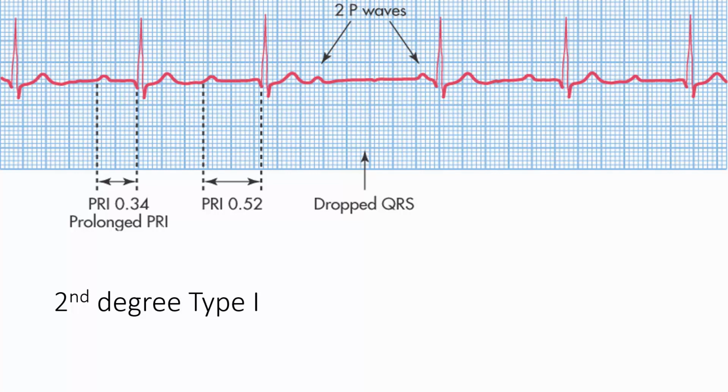I'm sorry, guys, I forgot the PR interval. That's the most significant thing here. So when you're looking at your PR interval, let's look at it real quick. We can't really use this one because we don't have the start of the P, so you always want to go here when you're looking at PR interval for the first one on the strip that you can see. So here's my P, and here's my QRS, here's my PR interval. Okay, so I do have a PR interval.